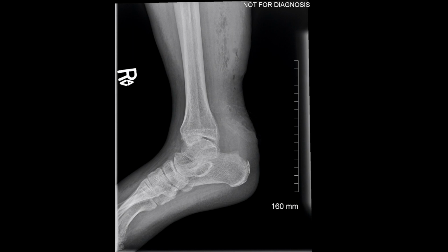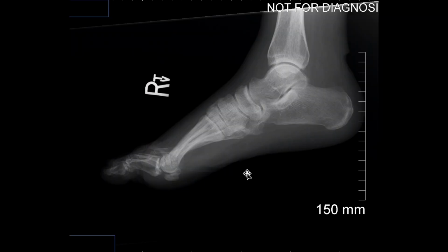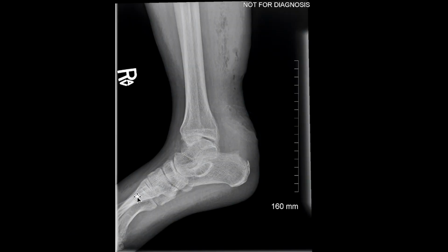Now remember, this came with a second image. The reason why I showed you this image, I told you this was a radiograph taken just 2 months earlier. And as you can see, we don't happen to see any soft tissue swelling along the posterior aspect, and we don't see any evidence of osseous destruction. So now you know this was an acute process. So osseous destruction, acute process, we were lucky enough to have recent radiographs.